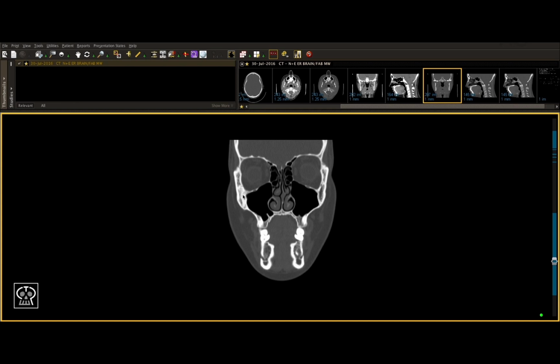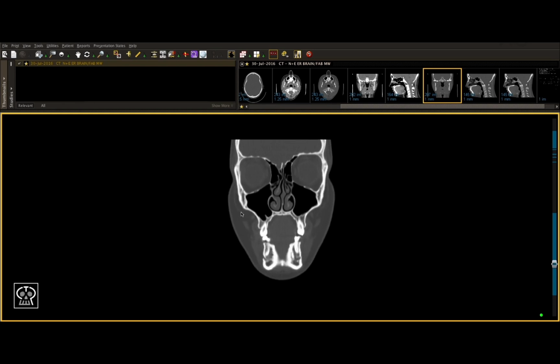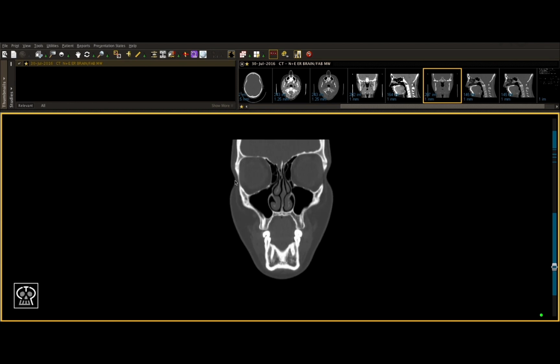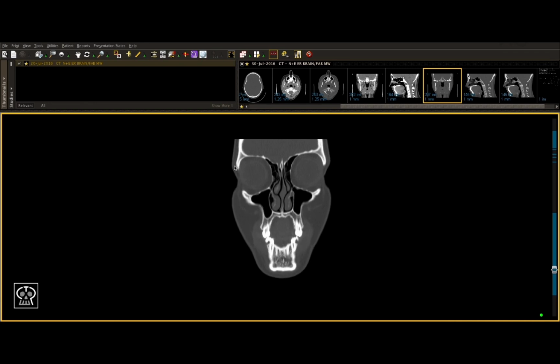Here we can see a suture line in between the zygomatic bone and the maxillary bone. As you can tell, it's incredibly faint, and sometimes these suture lines are hard to appreciate. This represents our ZM suture. If we go more superiorly here, we see this noticeable suture line between the frontal bone and the zygomatic bone. This represents our zygomaticofrontal suture, or ZF suture.